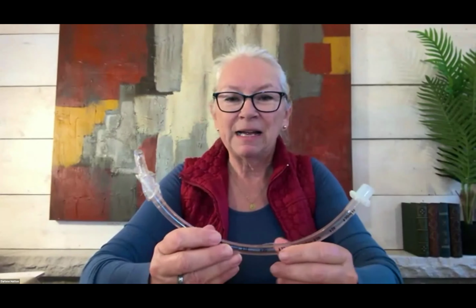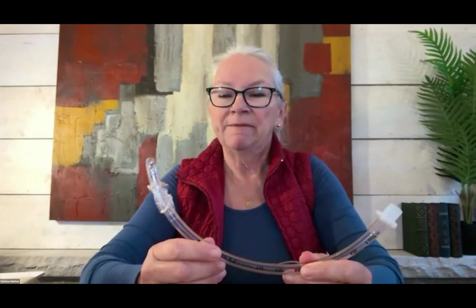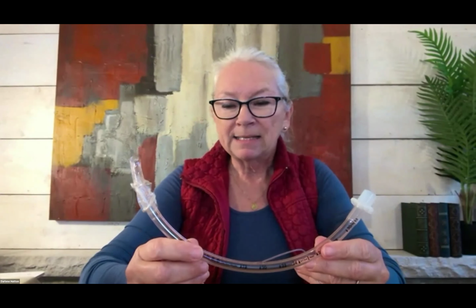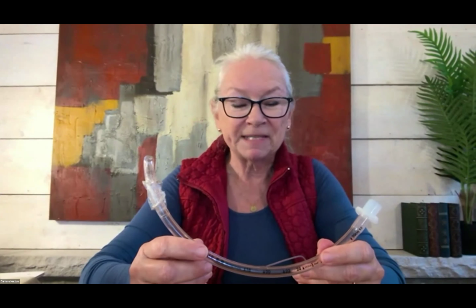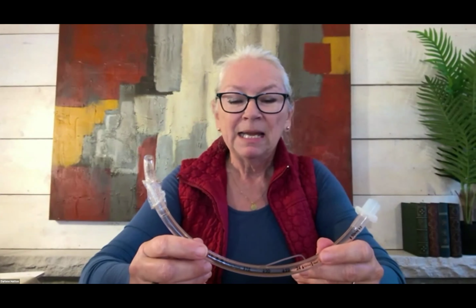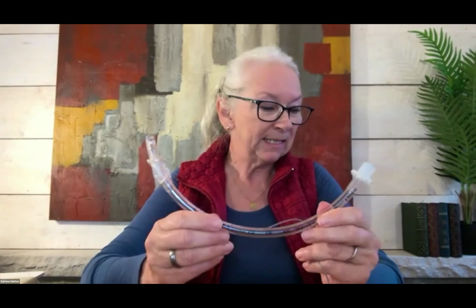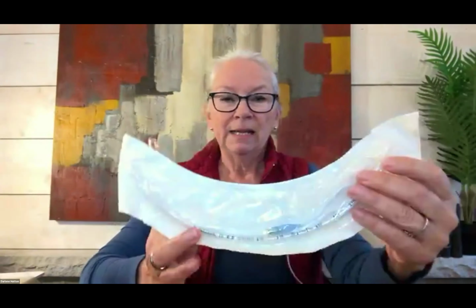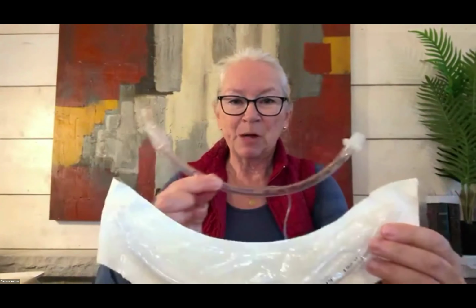So when we're talking about the most definitive, the most respected advanced airway, it is the endotracheal tube. The sizing depends on the decision of the person inserting it, whether it's the physician, the RT. For an adult, the average size is 7.0 to 8.5. This here is an 8.0, in the package. This is another example. This one is smaller in size.